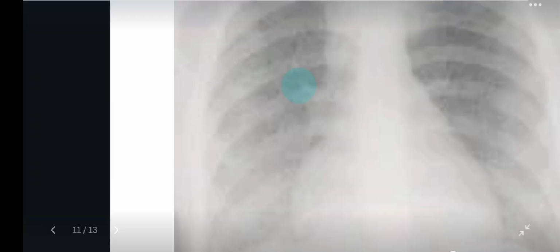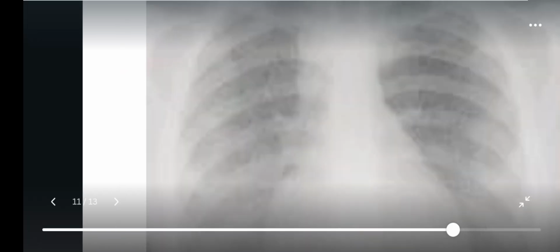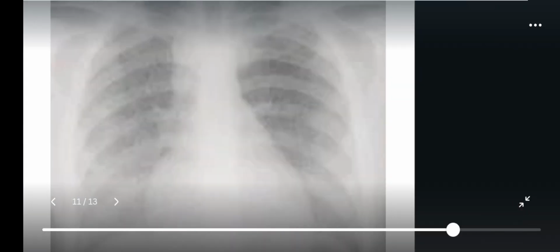Look closely, you will be able to make out the tiny nodules, which you can see diffusely in the two lungs. There are ones where the nodules will be more distinct, but if you can detect this level, then that one will be easier for you to detect.